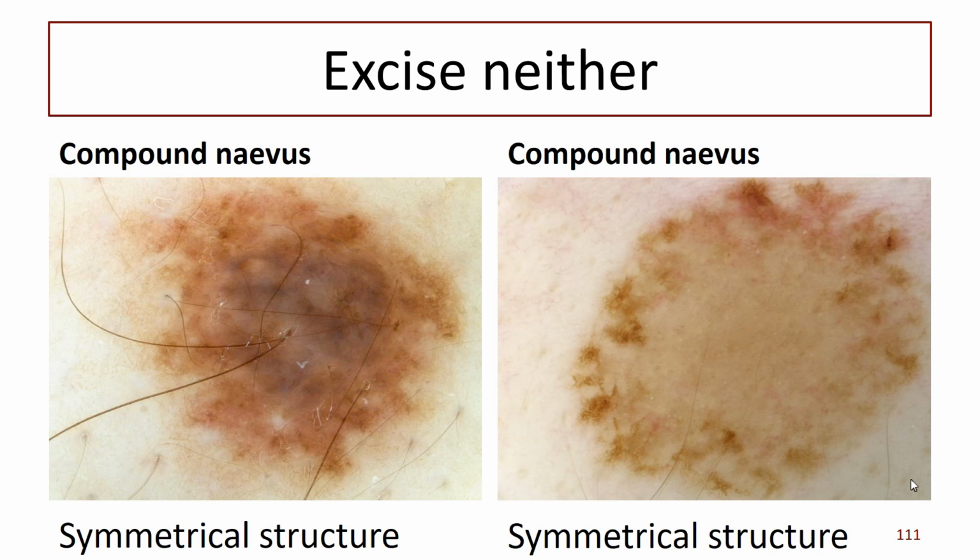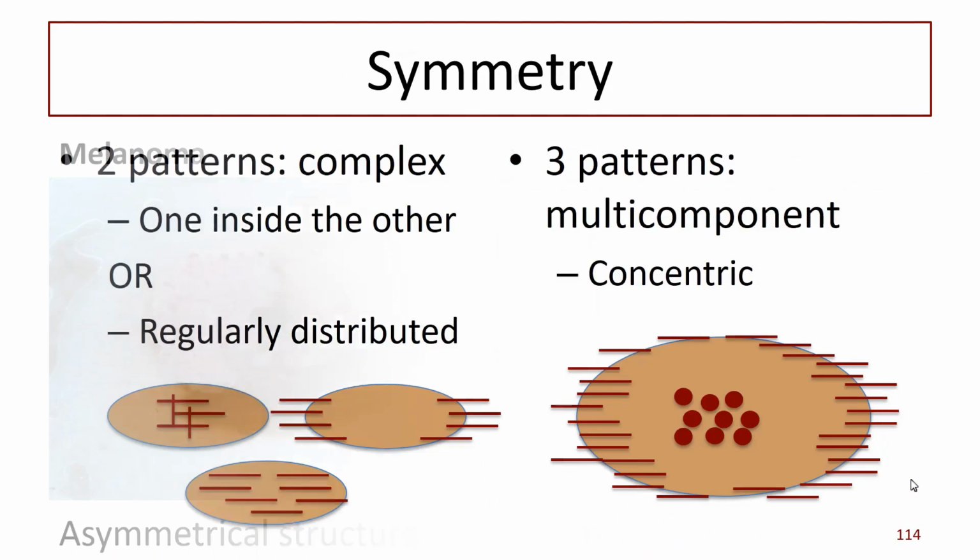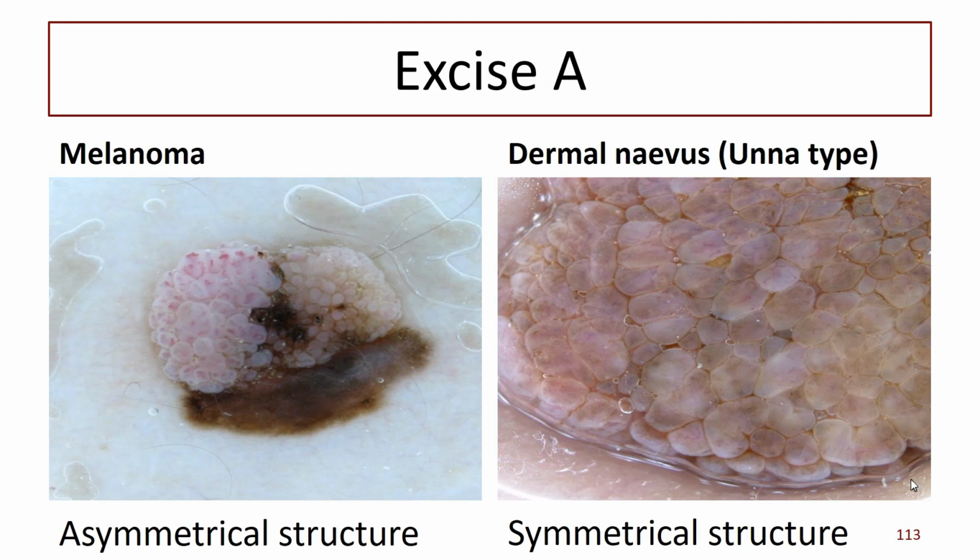Congenital nevi can look very, very funny. Congenital nevi often have hairs. This one was actually excised and turned out to be benign. So that's always helpful. But again, you may find that there are several lesions looking the same in a patient, and that's very reassuring.